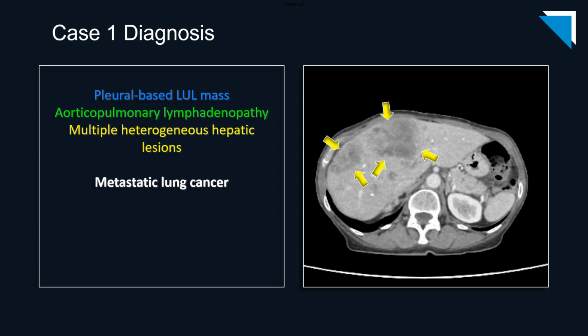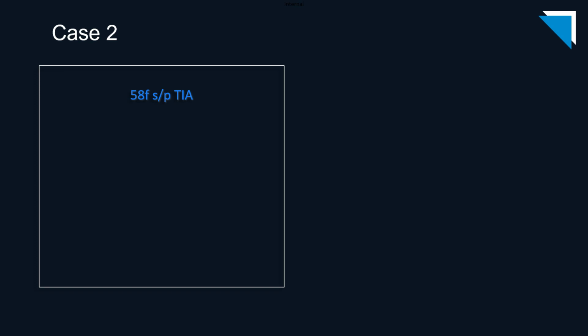In this case, we were first presented with a PA radiograph of the chest, and the finding on that image was in the left upper lobe. Had we focused only on that finding when reviewing the CT scan, we might have missed the metastases in the right upper quadrant.